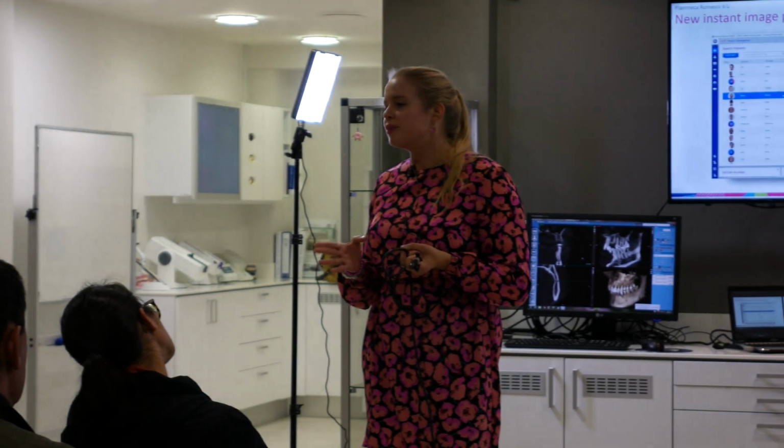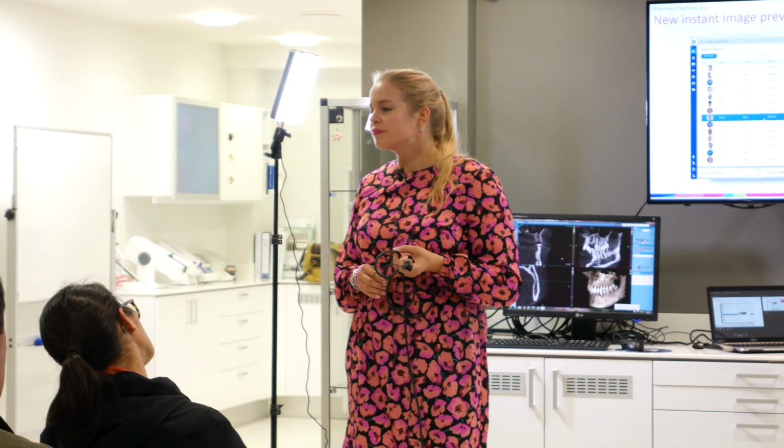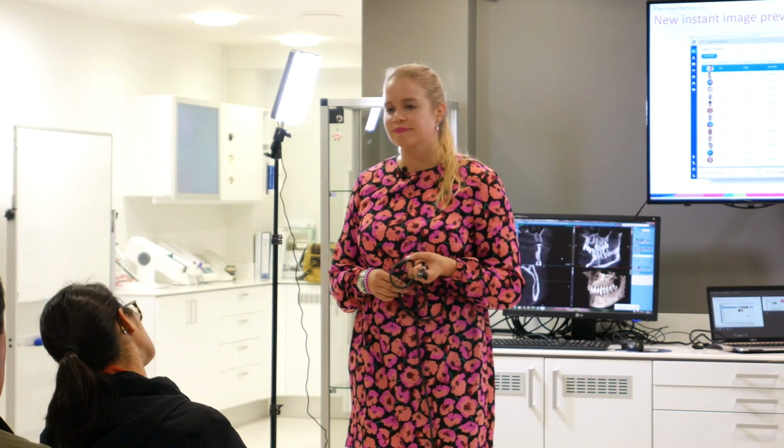But it has to be a tablet actually, so unfortunately, it doesn't run on a phone. Oh, it doesn't run on the phone? Yeah, unfortunately not. Only on tablets. Right. So iPad or Android tablet. Okay.